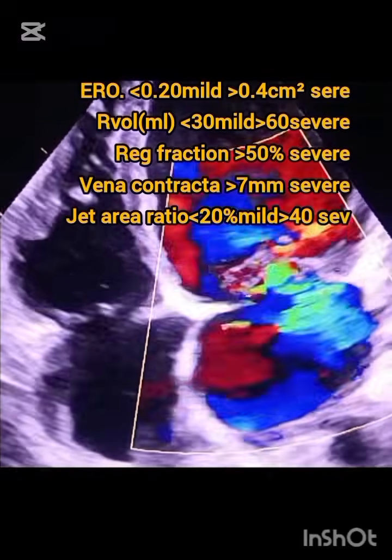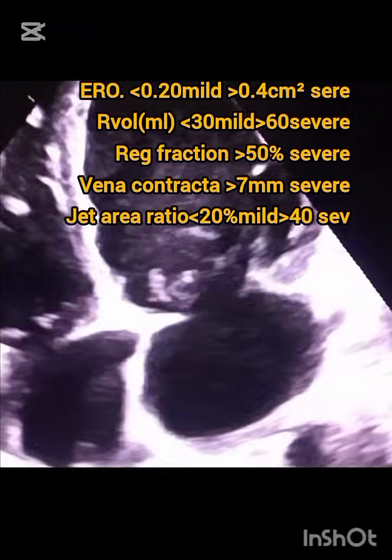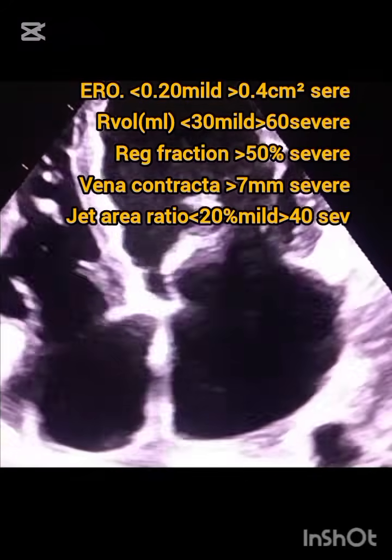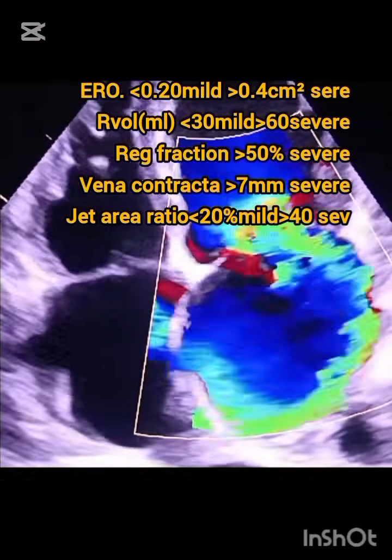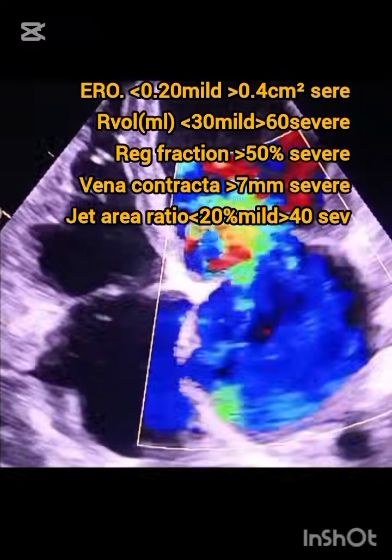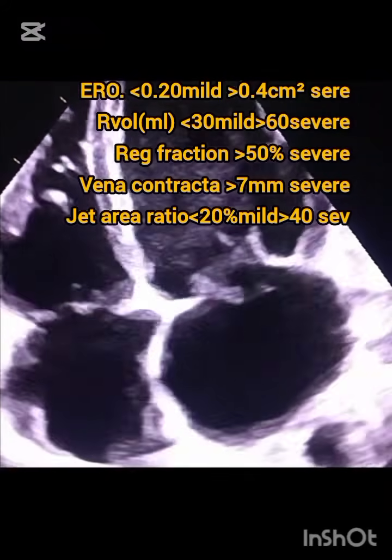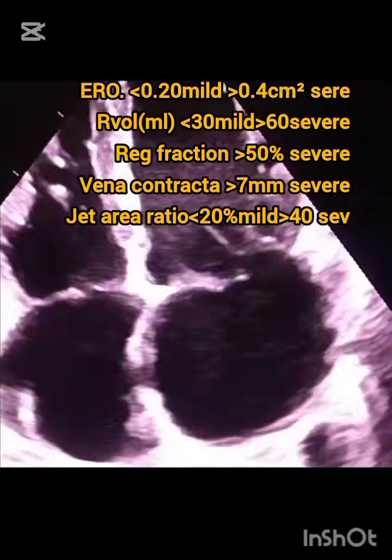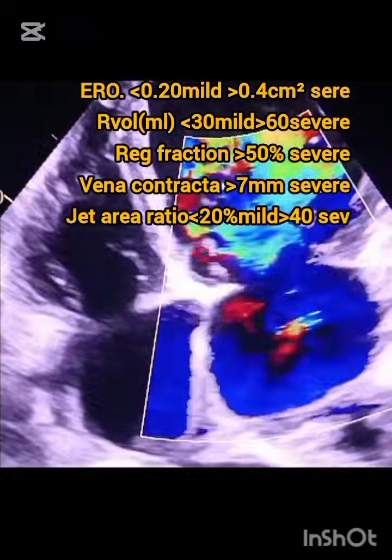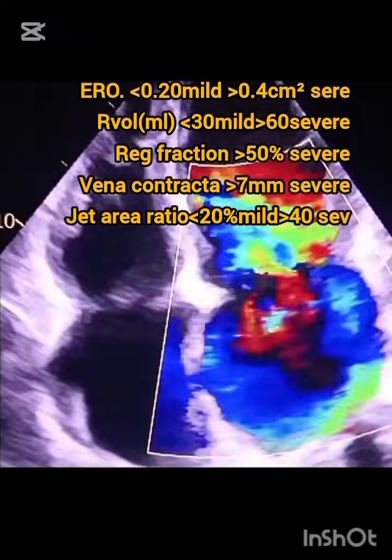Now take a note of the parameters of severity of MR. Effective regurgitant orifice less than 0.20 is mild, and greater than 0.4 centimeter squared will be severe, as well as regurgitant volume less than 30 milliliter is mild, greater than 60 milliliter is severe, and regurgitant fraction greater than or equal to 50% will be severe.